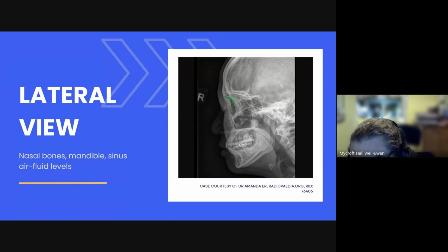We can see the eye socket, and we can see just how close it is to the maxillary sinus, which reminds us that when we get chronic sinusitis, there is a risk of it progressing into orbital cellulitis. But I think the thing that's most appreciated on this X-ray is the airway. Just see that beautiful nasopharynx, oropharynx, and nasal cavity, which is really quite large. It's quite difficult to get to the posterior nasal cavity, but it's really quite large. Very interesting. You can see the airway coming all the way down here. Really lovely image, that one.